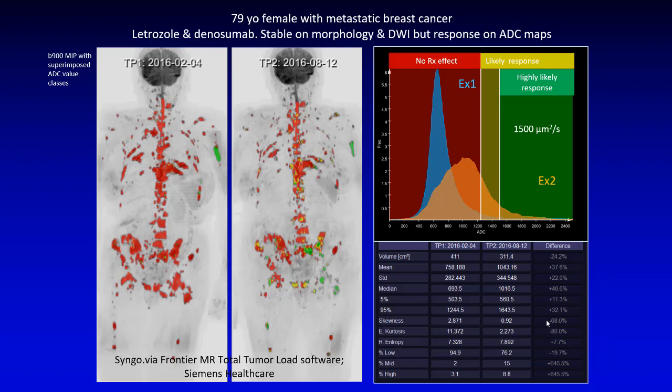You make space so the water molecules move more, right? There's a greater dispersion because there are spaces that are developing, so the range changes, right? The height is less, it's moved to the right, but not that much. This is response. But the interesting thing is you'll notice that it gets better over here, and over here, not over there. So it's exactly what I said.